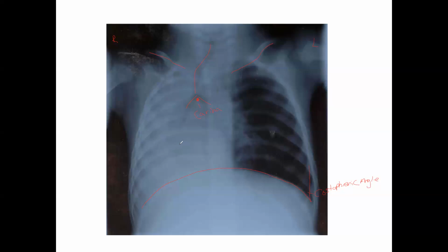throughout their lungs. Now, these are images that I acquired off the internet, so I don't have a patient history per se to go along with them. Just going over what I can share with you based on things we should be able to see as a respiratory therapist when we're looking at our chest X-ray.